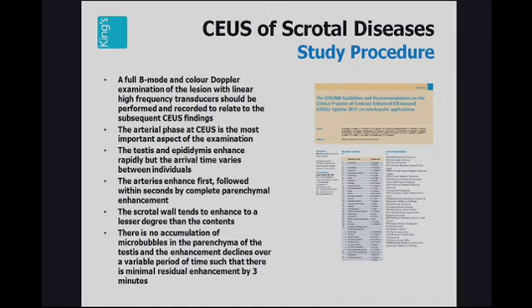However, over the last 10 years, the improvement in technology has allowed you to inject smaller and smaller doses for observing lesions in the liver. So 4.8 mils is perfectly safe and adequate for the patient. In the testes, you're only interested in the arterial phase and the early parenchymal phase. Examination for about a minute to a minute and a half is all that is required.